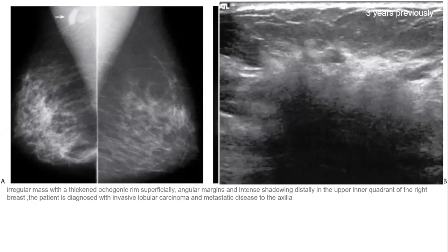Sclerotic cancer, sclerotic type cancer. Lobular carcinoma. Yes, it is commonly seen with lobular carcinoma, though the common presentation of lobular is a focal disease, not the diffuse shrunken breast. But when you see a diffuse infiltrative breast with shrinkage, think about lobular carcinoma as a common cause. But lobular itself does not commonly present in that way.